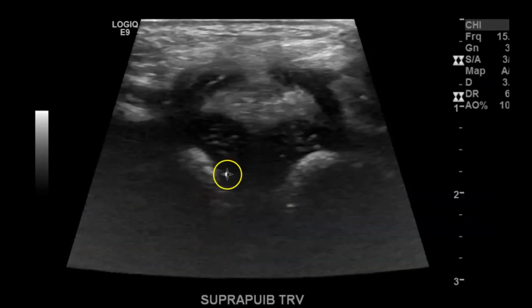So females don't have scrotums, but they do have tracts of tunica vaginalis similar to the tract you would see going down into the scrotum. And this is called the Canal of Nuck. You can have a Canal of Nuck hernia, which can be just fluid, like a hydrocele, bowel, or can include the ovaries or the ovaries and uterus.